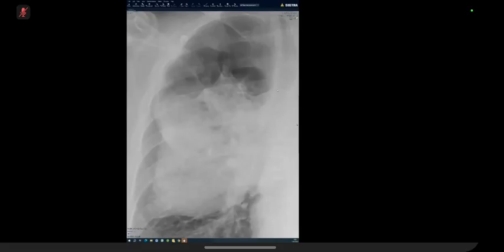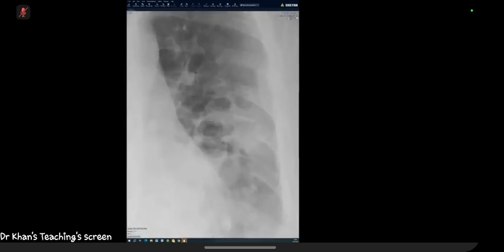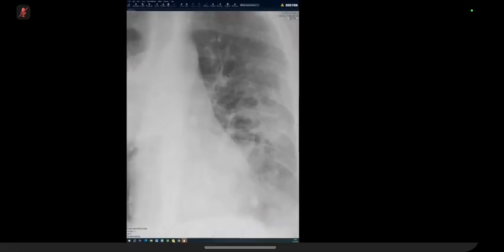This may be multi-component. Yes. This can be maybe a cystic lesion but not typical, with no fluid level. But the shape, about this one? Maybe here multiple cavitations or multiple cystic changes in the region.